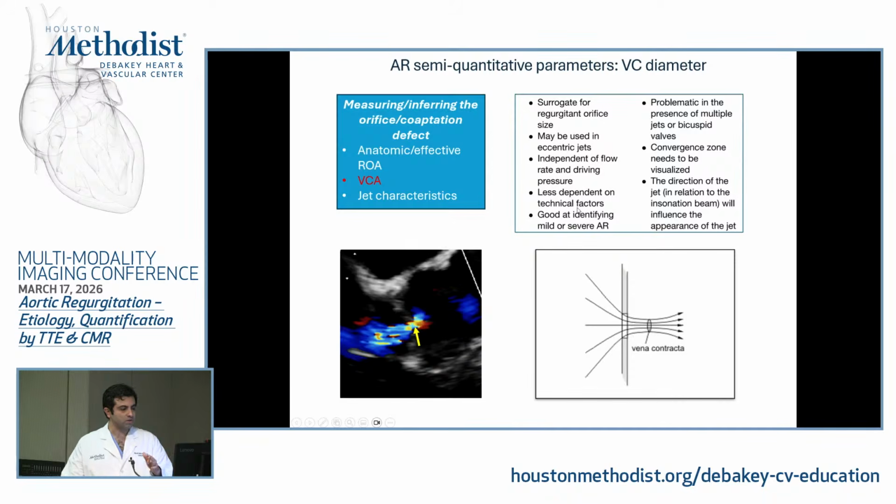It's not as dependent on technical factors. You know, it's an easy, nice way to decide mild versus severe. But like I said, you have to have all the components of the jet.